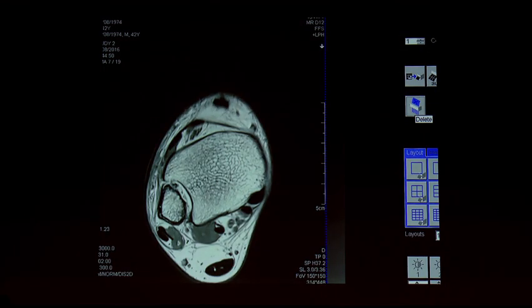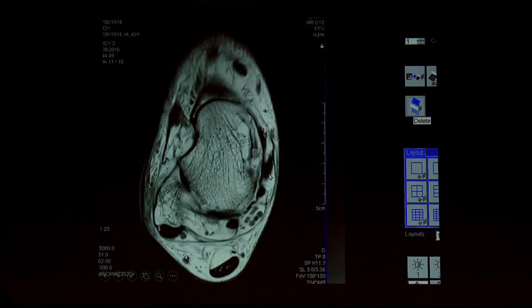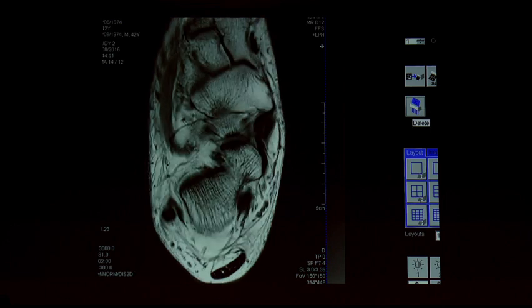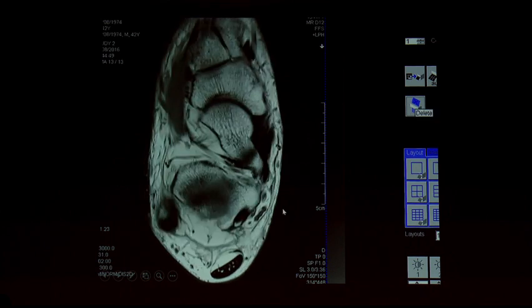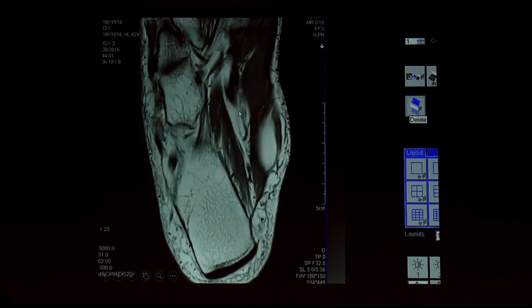So we have completed the lateral tendons. Coming to the medial tendons, there are three important tendons: TP, FDL, FHL. FHL will have a large belly. This is classically what we have to look for. If you are going down normal anatomy, you can see the TP beautifully going down, and you can see the navicular insertion and small insertions over the cuneiforms as well as the second to fourth metatarsals. And this is FDL, and this is FHL. FDL and FHL cross over the master knot of Henry. You can see here, this is the typical appearance where they are crossing over.